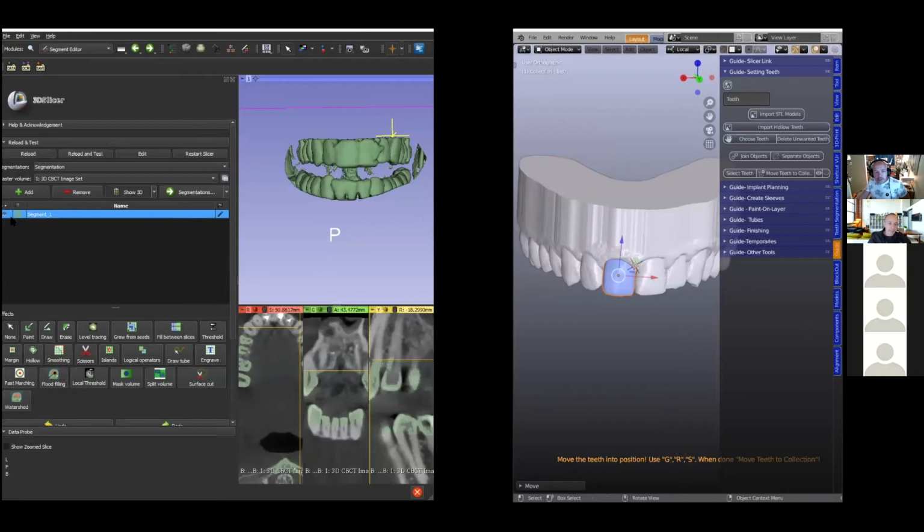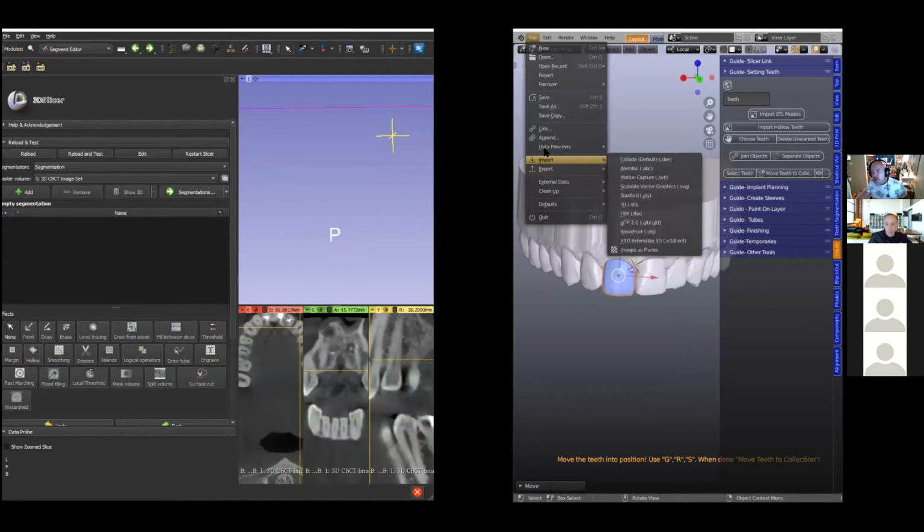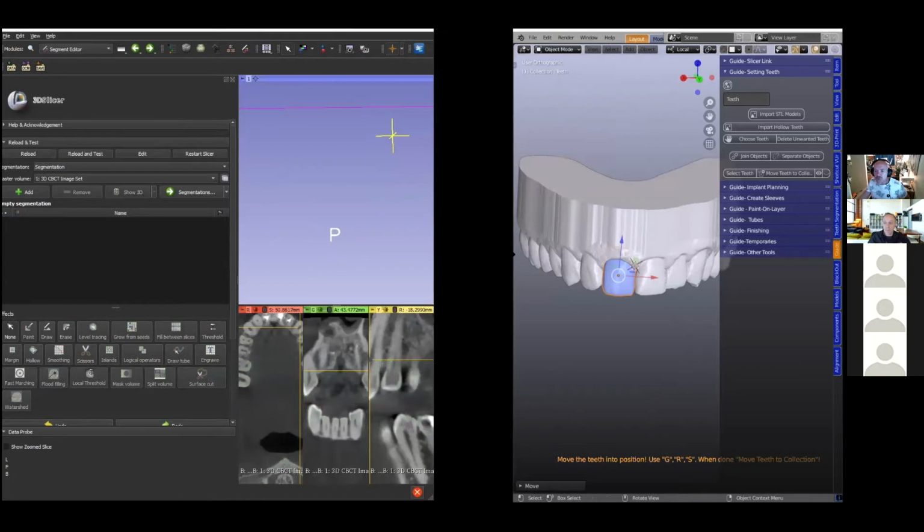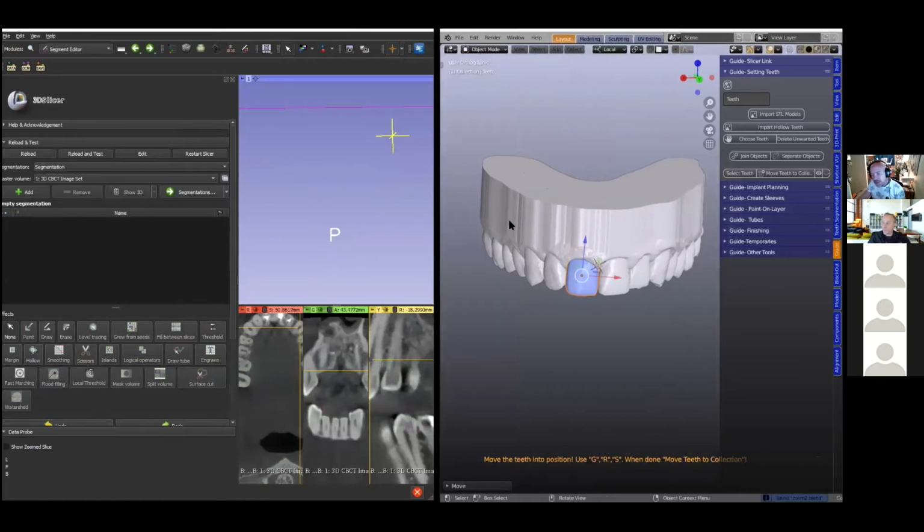Okay. Yeah. So this model is redundant, and this is a segmentation model. We don't need it anymore. Remove. But I do stress that you should always save your work. Blender saves it automatically every 2 minutes or whatever. You can set the automatic saving, and this is a good idea because if ever you want to revert to something beforehand, you can call it up. And likewise with 3D Slicer, always save your work, never like in between stages.